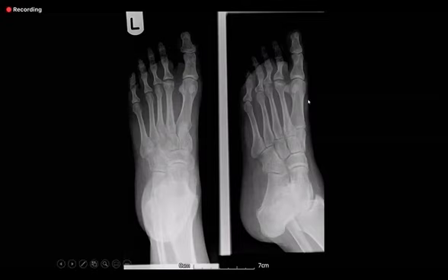Right. Okay. So on this view, I'm looking at the midfoot congruency of the Lisfranc joint. It is normal, and looking specifically at the calcaneal talar alignment, there's increased sclerosis at that point, and on the lateral view, I established that there is a coalition at this point.